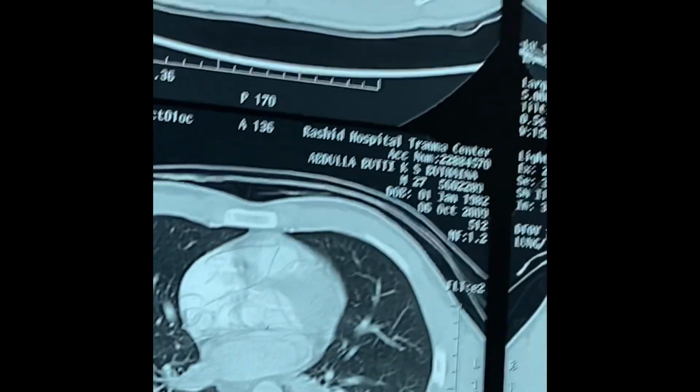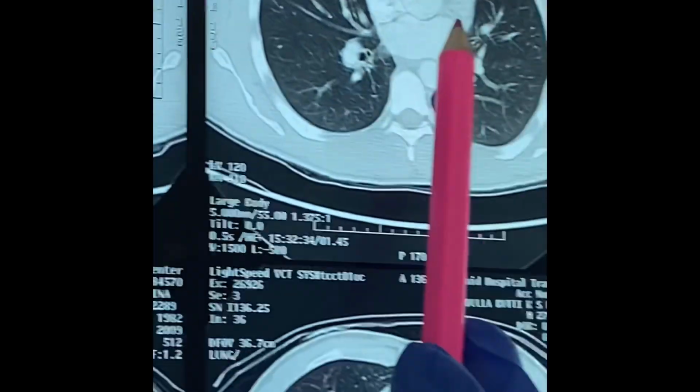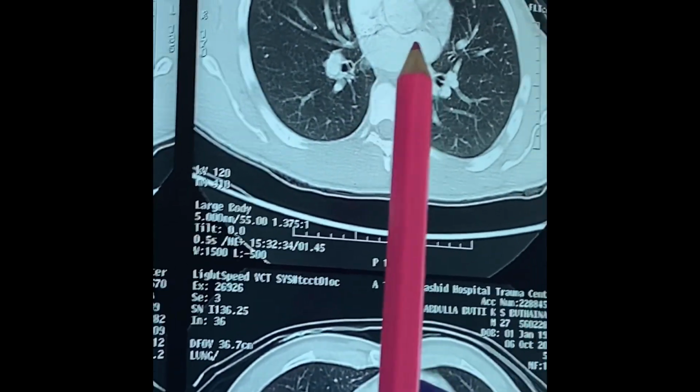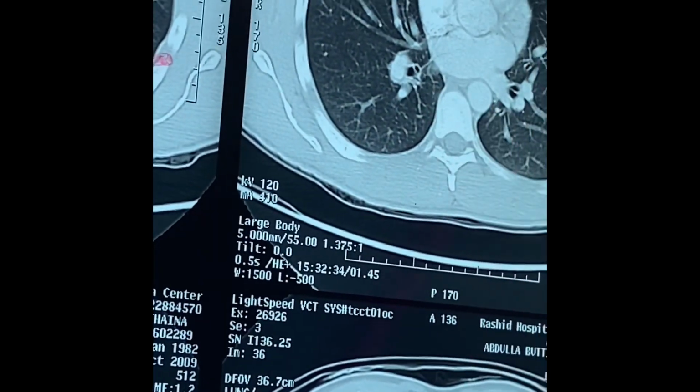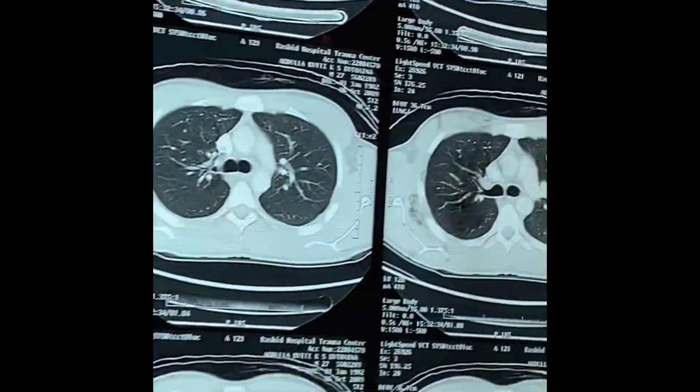As we move up, in this picture, in front of the left atrium, other structures have started to branch. Now we will move on to the next. We will take over from here on the next section.